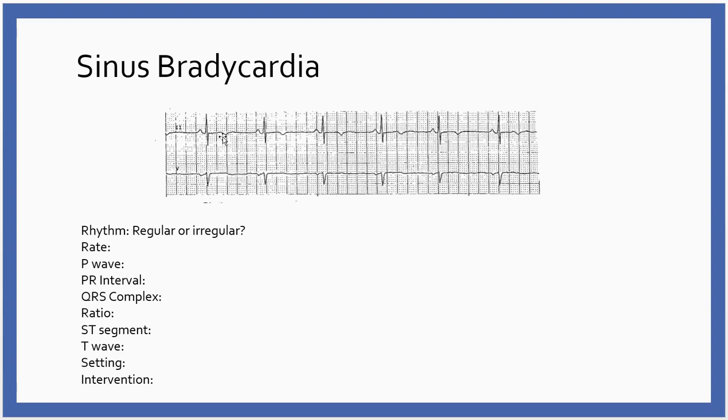So here's my T wave, and you'll notice it's not upright and rounded, it's inverted. But here's my ST segment, which does go back to baseline. So if I draw a baseline, I'm back at baseline there. So my ST segment is isoelectric. The T wave is abnormal in that it's inverted, and I'm going to do a QT interval.